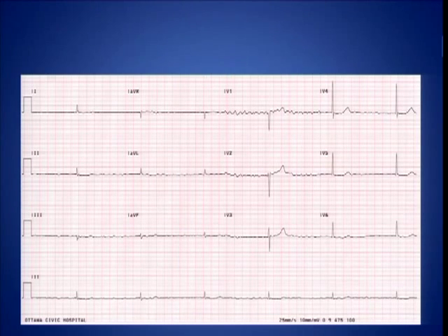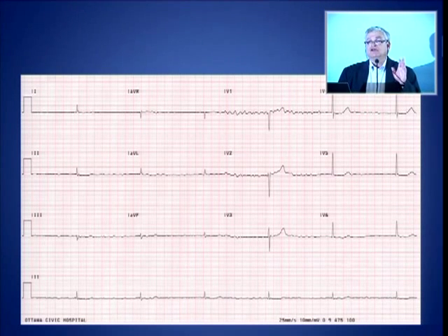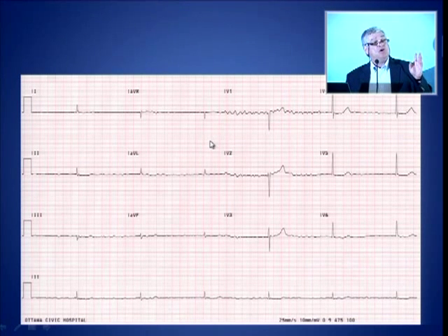We'll go into this the next day. Lastly, describe what you see. We've said it before. When you make the description, the answer becomes apparent. The atrial rhythm is irregular. It's lumps and bumps and diddles and squiggles, right? So what's the atrial rhythm? Atrial fibrillation. There's no discrete P waves.